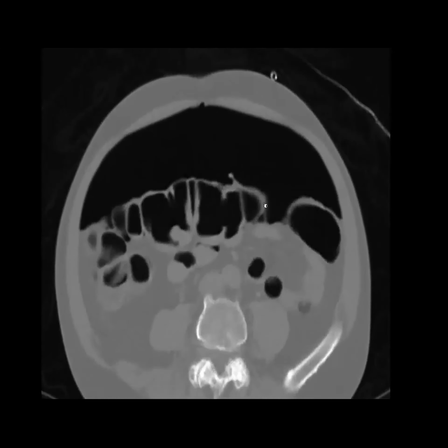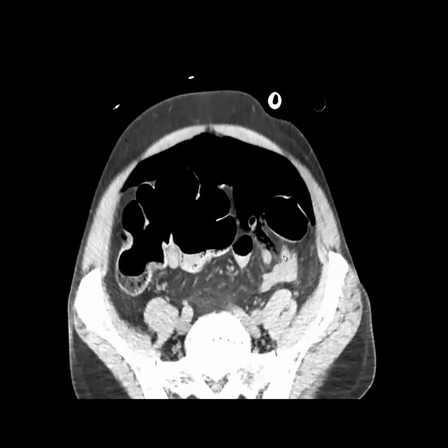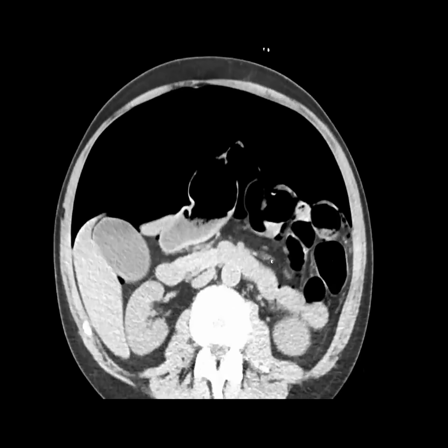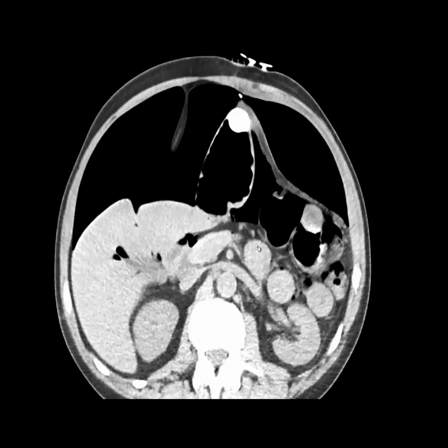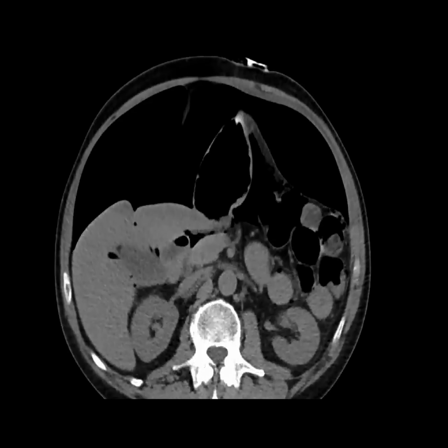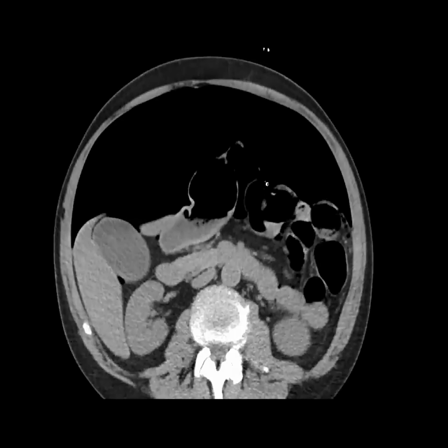And this patient had symptoms. One pertinent negative I found is that there's no fluid and there's no feculent material, because they were wondering, could we have crossed the colon? Could we have perforated the small bowel? And I find that when I don't see any of those other fluid or feculent stuff, then it's probably just air coming out of the stomach.